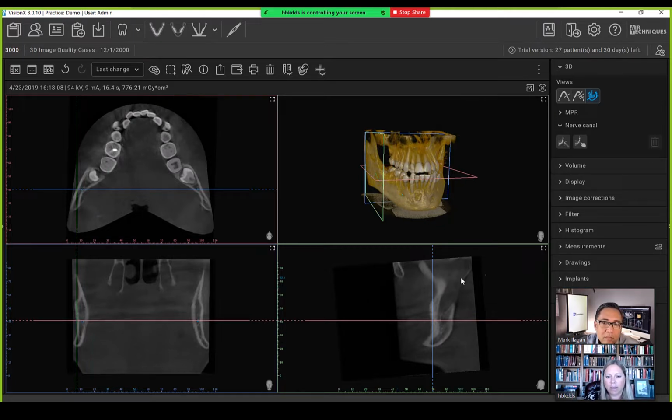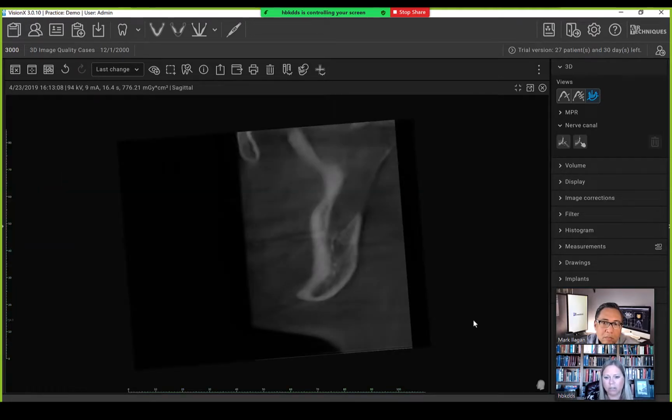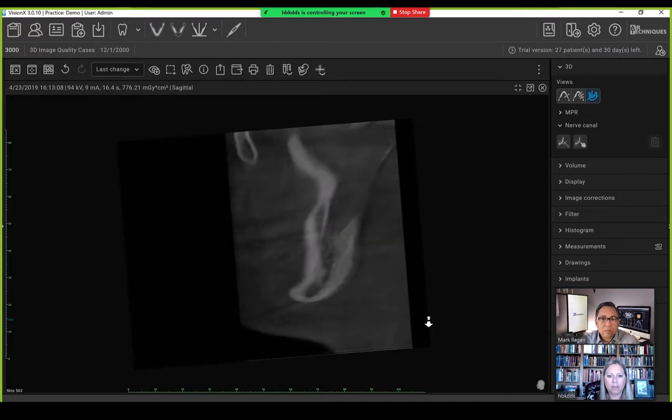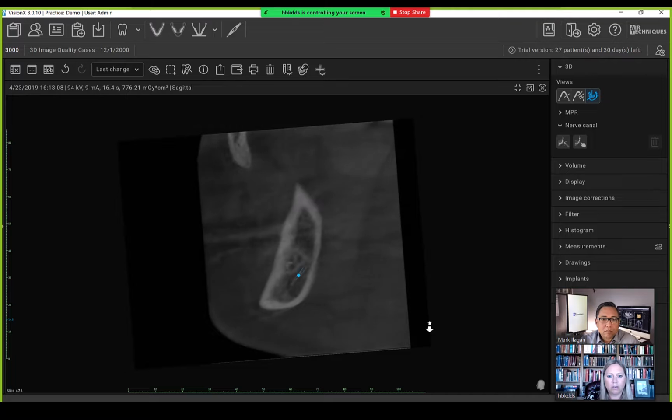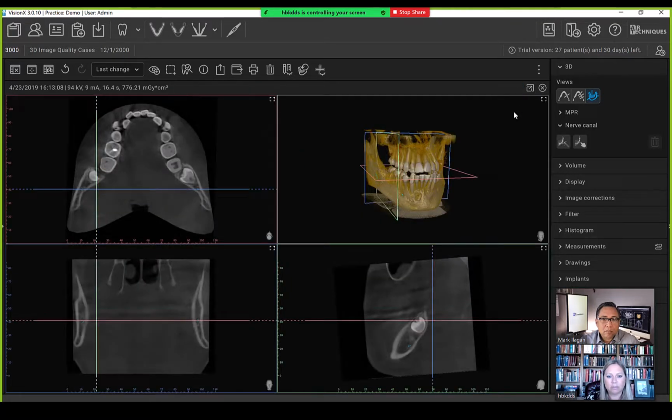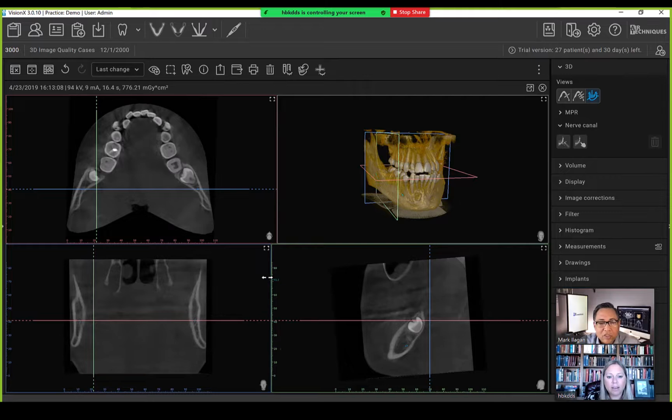Okay. And then typically with this, I'm going to go ahead and, with any of these, I usually enlarge this, but definitely want to take a peek. Let's see if we can make it go down through. Actually, oh, okay. You could also drag in between the windows to make one window. Can I? Yeah.